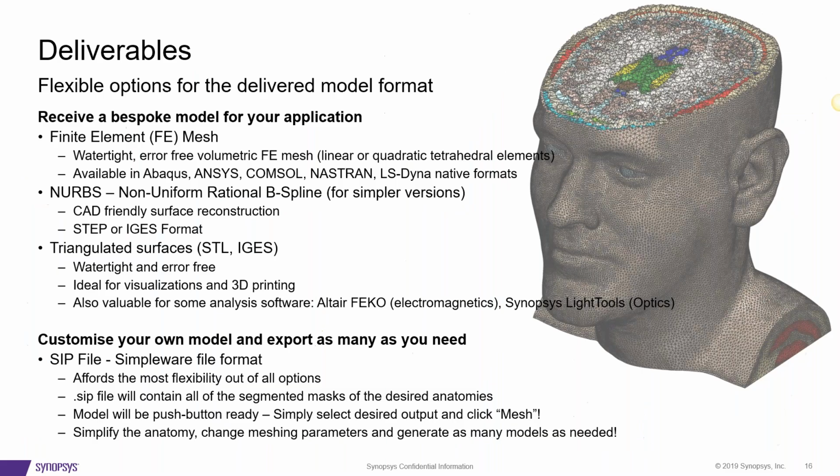So as with all Simpleware human body models, the format of delivery of this model is extremely flexible. So there's typically a very streamlined method that you can make use of the model in your advanced design workflows. So whatever simulation package or CAD package you're using in your product design development, there tends to be a pretty nice method to make use of the exported model directly in that workflow.